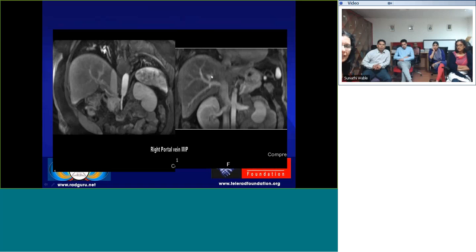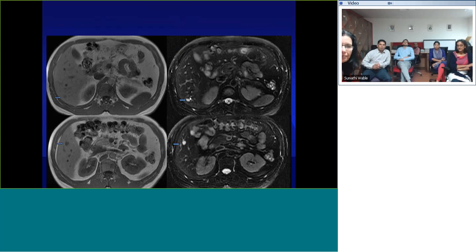And you can see that it always follows the vascular signal, and also helps. And for us, we found that the coronals also helped us to give one more perspective of the problematic cases, and it really does help sometimes. And common lesions also can occur in these diseased livers, right?